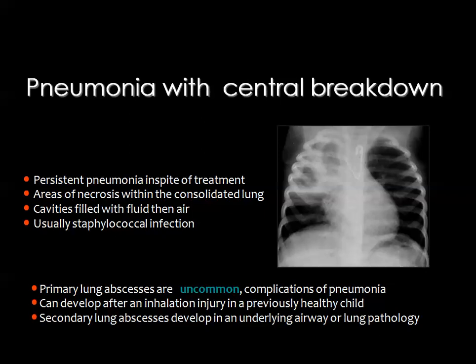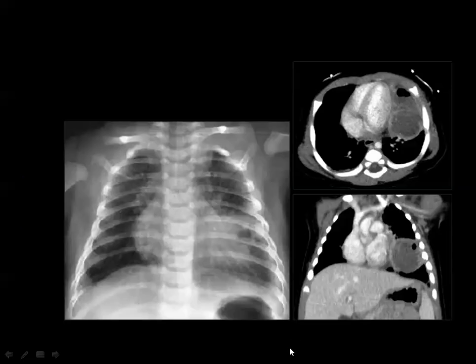This may result from persistence of the infection and poor response to medical treatment, resulting in the development of cavities within the area of pneumonia consolidation, and this is commonly seen in cases of staphylococcal pneumonia. Of course, you see here a foreign body which has been aspirated, and it may obstruct the trachea or bronchus, resulting in this unresolving inflammatory process.